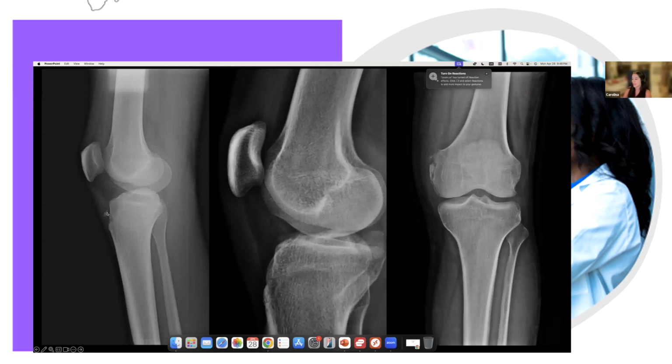Now here, this is the tibial tuberosity. This is an avulsion of the tibial tuberosity by the patellar tendon. And it's something that we can see either traumatic, or in many cases from repetitive movements like jumping in adolescent boys, basketball players, stuff like that. There is an avulsion of a very well-developed patellar tendon that takes off the tibial tuberosity.